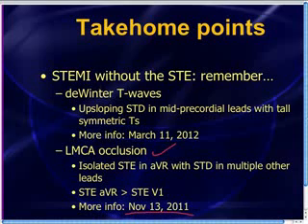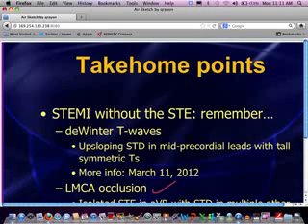We went through a whole bunch of cases back then, and what we talked about is the fact that if you have ST elevation in AVR in conjunction with ST depression in multiple other leads, and especially if the ST elevation in AVR is greater than the ST elevation in V1, that's highly predictive of left main coronary artery occlusion. Those patients are at high risk for developing cardiogenic shock. This patient was already heading towards a shock state, and fortunately the physicians and Matt got this patient up to the cath lab very, very quickly.